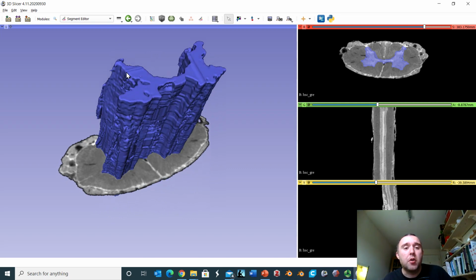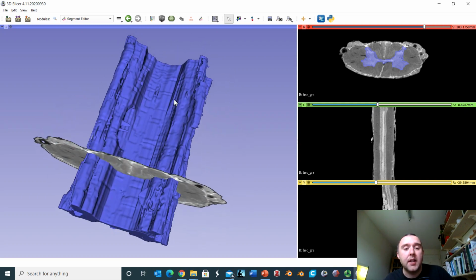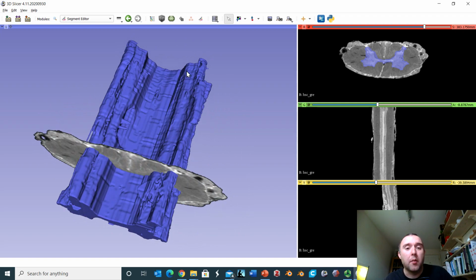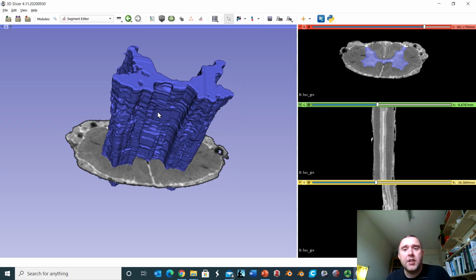We can see that the dorsal horn is just the same, and if we rotate this round, we can see that the dorsal horn forms a column within the spinal cord. So it is not only the white matter that is organised longitudinally, the grey matter is as well. Specifically to the cervical enlargement, we can see that the grey matter here is large, there's a big area of it as we discussed earlier, and particularly these ventral horns are very prominent to distribute through the myotomes in the brachial plexus. So that's the cervical grey matter.